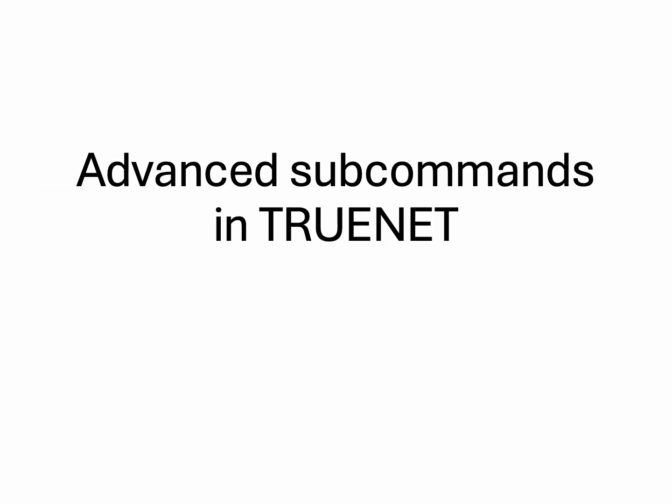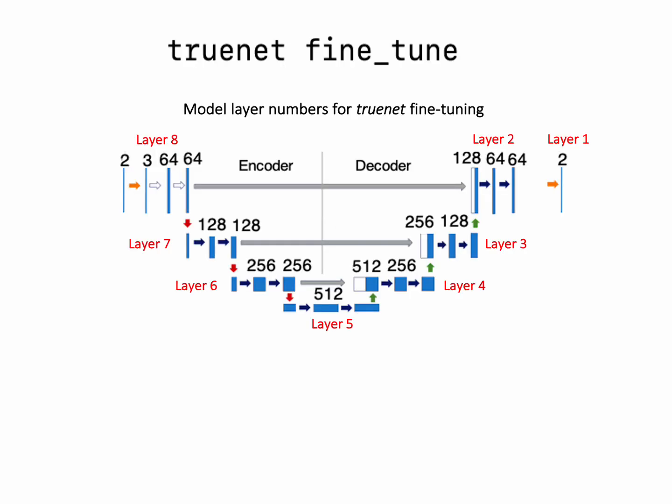Okay, so if you remember, I also introduced two additional subcommands for TrUE-Net. One is fine tuning and the other one is the cross validate option. So we are going to go through it now.